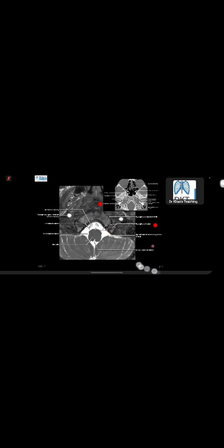This is a 3 Tesla MR, so the resolution is extremely high. One key point to remember is the hypoglossal canal. On a CT scan it is easy to see, and this is in your part 1 exam. They will ask you, this foramen between this and this is the hypoglossal canal, and you can see it on this MR and infer that this is the foramen. So this is a hypoglossal canal.